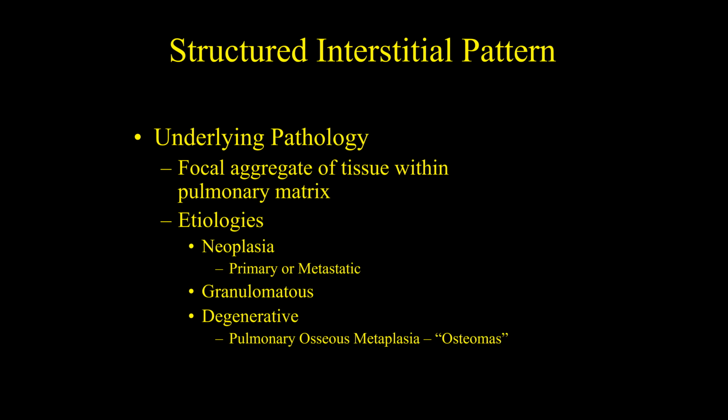So again, in review, our bronchial pattern is the presence of thick-walled bronchi or tram lines in the periphery of the lung lobe, and it's caused by allergic lung disease or parasitic lung disease. The second pattern was the alveolar pattern. An alveolar pattern is characterized by the presence of air bronchograms, true air bronchograms, or complete whiteout of lung.